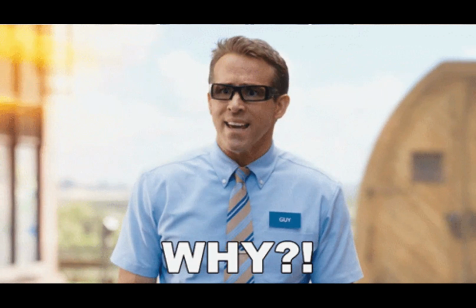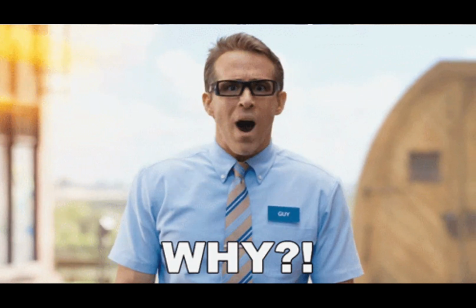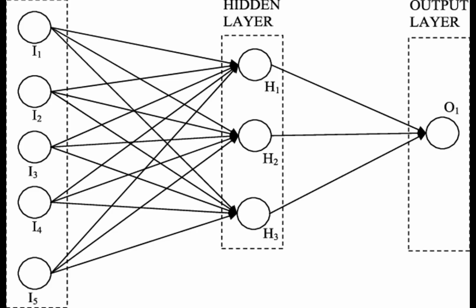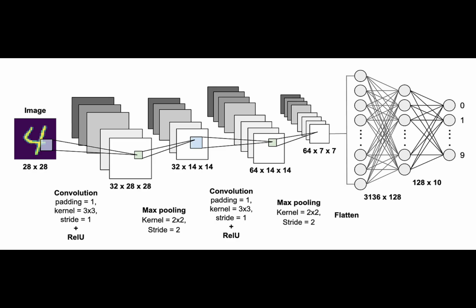So why exactly do we use CNNs and not any other model? Well, when we are faced with the challenge of analyzing a high resolution image, which is packed with a ton of pixels, the other type of model, an ANN, an artificial neural network, will take a lot of time processing it since it goes through every single pixel. This allows CNN models to be more practical and more efficient when it comes to dealing with high resolution images, since they only look for key features.